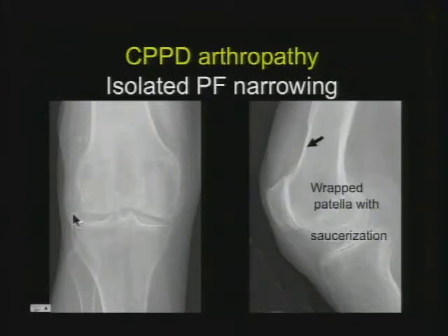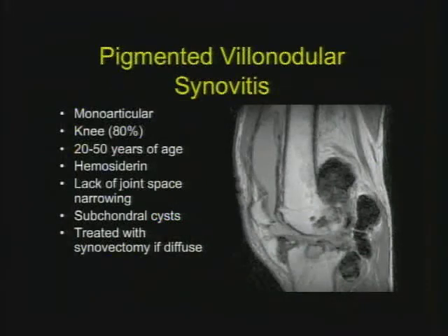There's hyaline cartilage here that we're seeing it in. And later we'll see that CPPD can calcify anything, tendons, ligaments, capsule, can have big tumoral masses, so that's something to keep in mind. And this is very classic right here. I do have to say that the most common presentation for narrowing of the knee joint is not this presentation, but just having medial narrowing, and it looks just like OA. But when you do see this presentation, it's an Aunt Minnie that we all recognize.